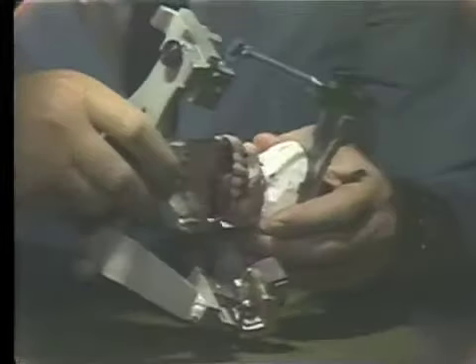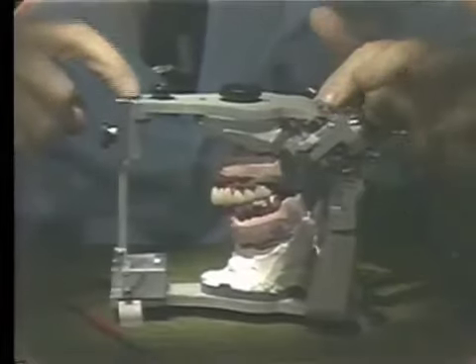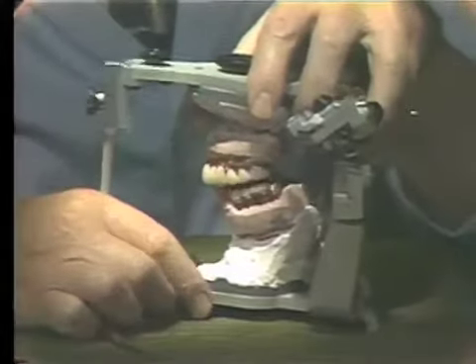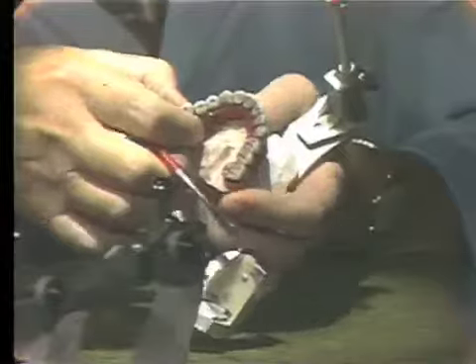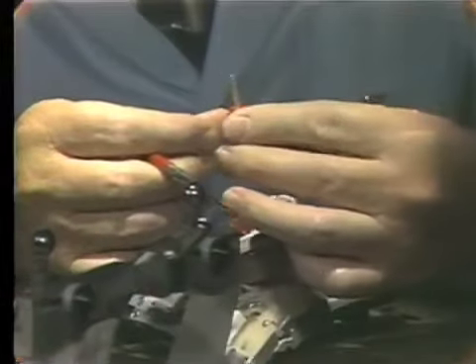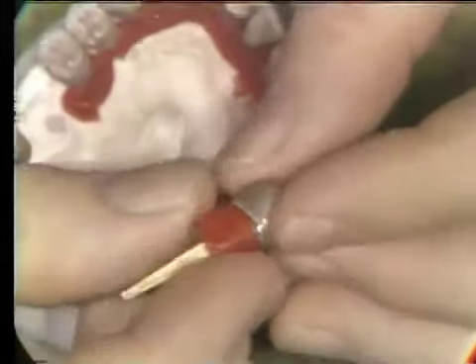To check the castings and the work back from the laboratory, we'd want to make sure that we have maintained our centric. Check to make sure that the pin is down on the incisal table and the condyles are down on the condyle balls. To make sure that we have maintained our occlusion, you want to make sure that the dies are seated well in the master models. In the waxing procedures, a die could collect wax under the base so that in the final occlusion we would have the die elevated out of the master model and the occlusion would not be right. So make sure that all of the wax is off from the base of the die. We also would check at this time the accuracy of the margins and the casting.